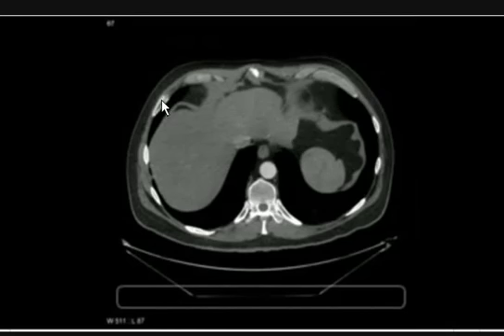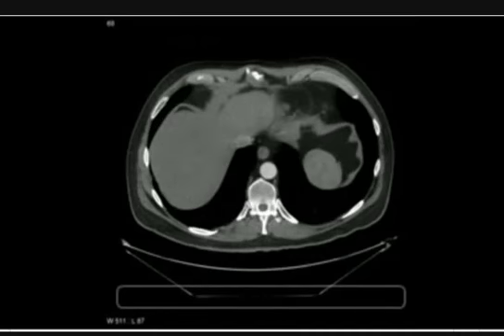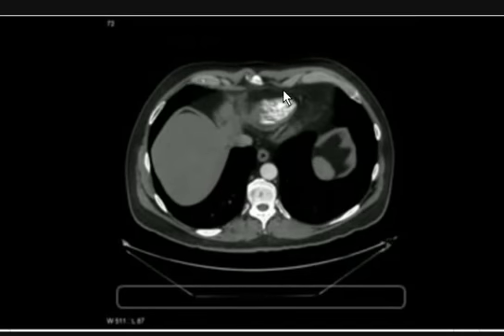Anyway, so these are ribs, this is skin, and below the skin you can see fat. This is liver. The black shadows here are lungs. This is esophagus. This is a spleen here. This is diaphragmatic muscle here. This is left lung. This is vertebra here. We'll move up slowly. You're beginning to see contrast.